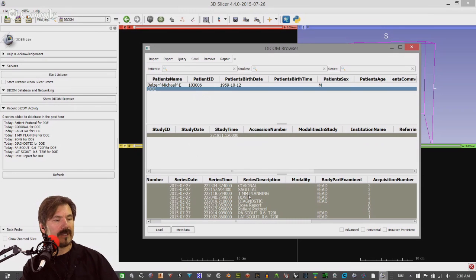And the one that we're going to focus on today is the 1 millimeter planning. What I found is that some of these can focus on, again, a 2-dimensional emphasis. So if you want to do a coronal or sagittal emphasis, you would only get that. But for 3D, you need to have, like in this 1 millimeter planning, the same quality for each of the different views. So you'll have to be careful. It's one of the things that is a little cumbersome with this.